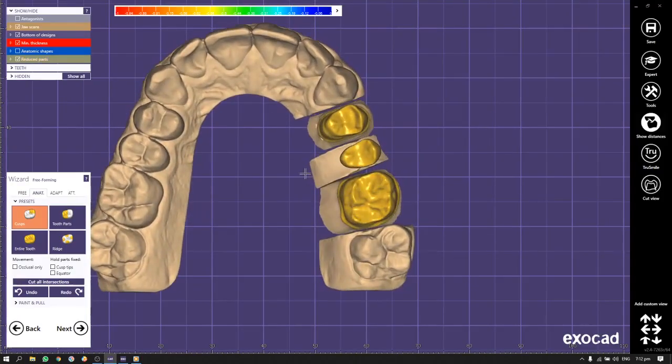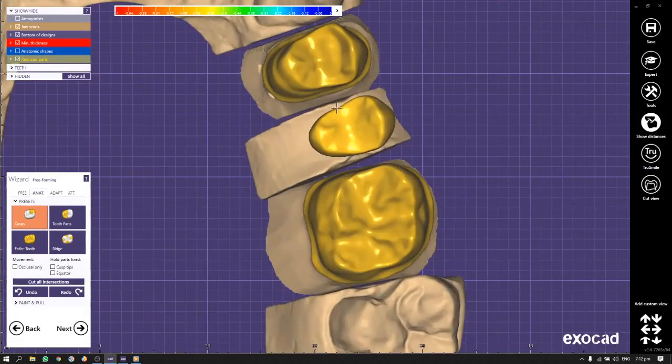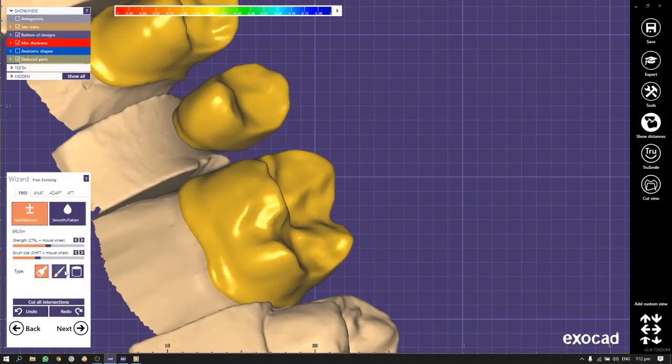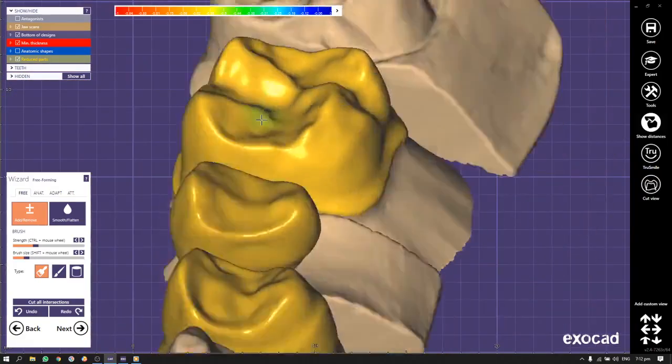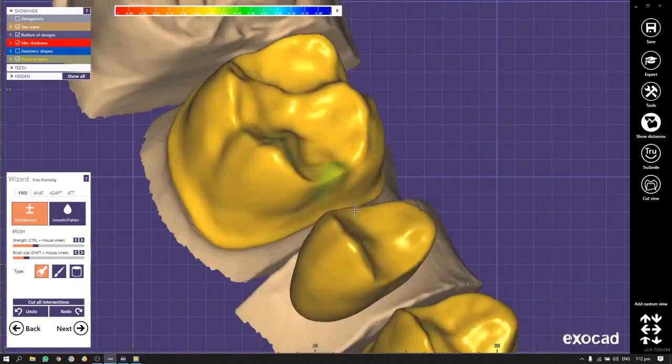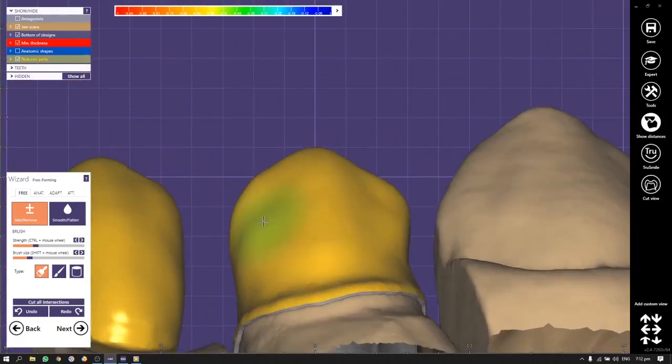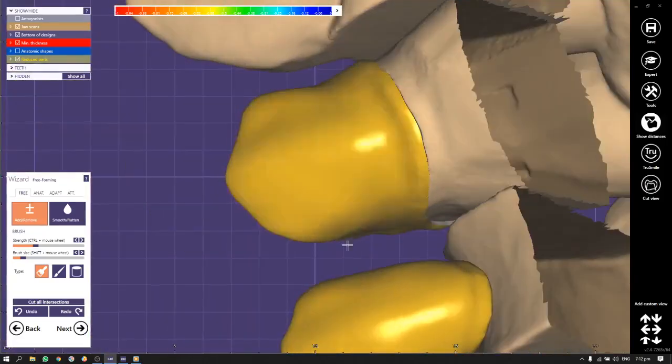That's how it looks like. It's quite sharp. On this step we have to smoothen it out and to flatten it a little bit. So we go from anatomy to the freeform. I choose the brush. You can choose different strength, different size. I showed you how to move, increase and decrease here in this mode. You can do it during the design.